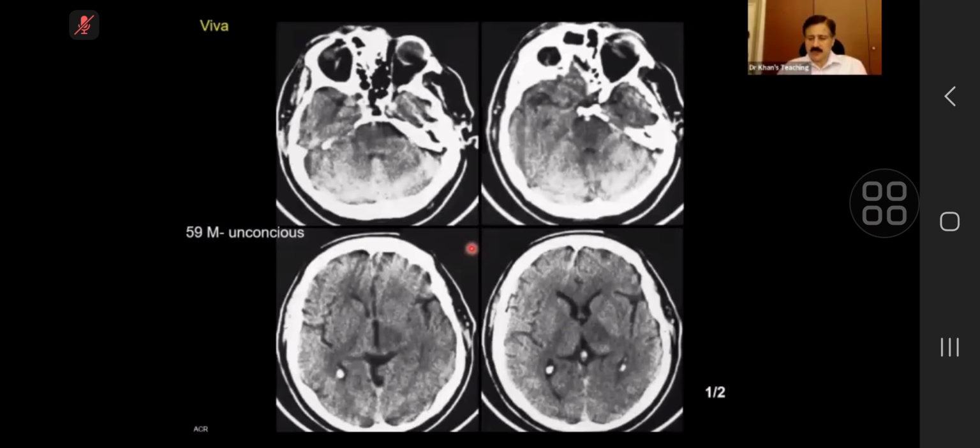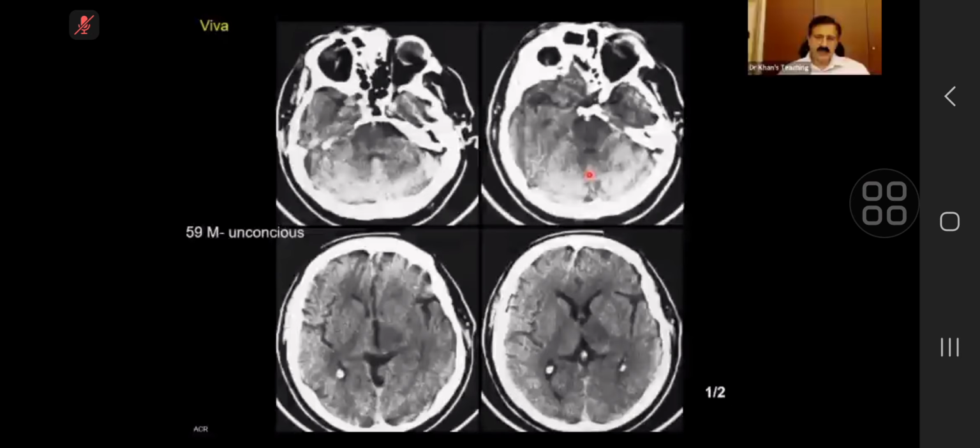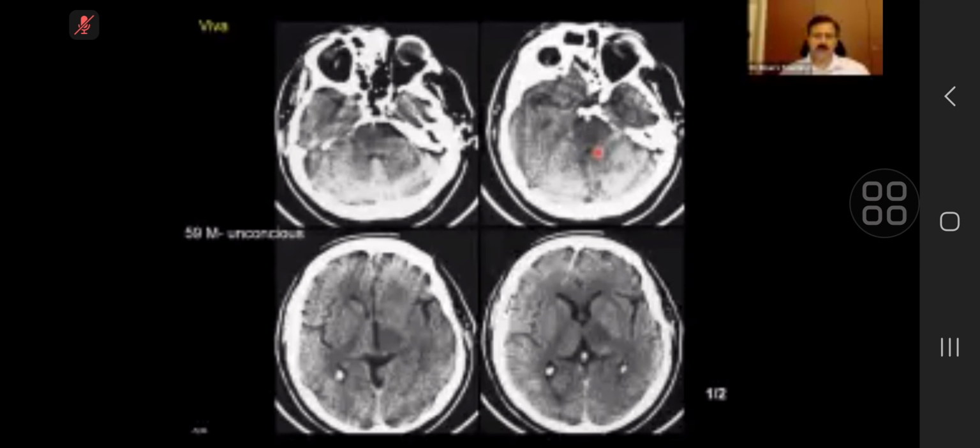This is your last case. Unconscious patient. I can see a dense basilar tip, so in keeping with basilar thrombus. Excellent. Now, basilar artery is your friend. It should be one of your checkpoints for the exam. Look at it as one of the review areas. I've shown you a case of leptomeningeal carcinomatosis or TB, in which it was enhancing, meaning that was with contrast. But basilar artery thrombus is a very important exam case. It will always be subtle.